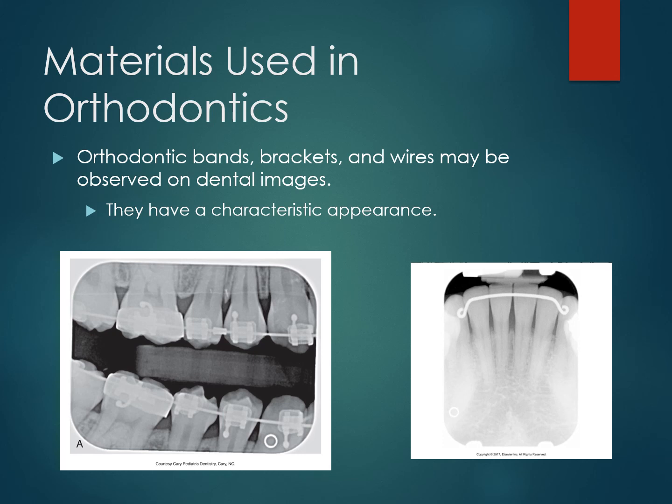And so this is another key reason why we do not let our patient leave, or we have our patient sitting there with us while we look at these images, because these are pretty normal. These are very common things.